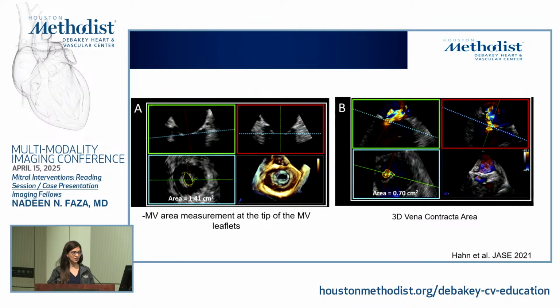Same goes for 3D color. Using 3D color, you're able to go to that vena contracta area and measure the area, and that also helps you evaluate your MR severity.